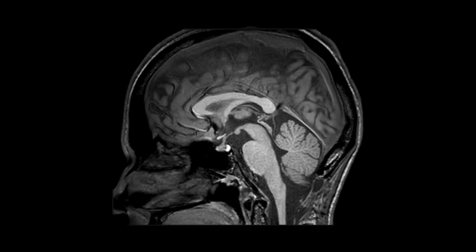So here is an MRI scan of the brain. This is about CTs, but if you want to look at the ventricular system, an MRI is perfect for this. This is a T1 weighted image MRI. How did I know that? Not in this video, but basically any fluid is black, or dark signal, as we call it on an MRI. So all of the white structures are solid or mixed, and all of the black structures are fluid.